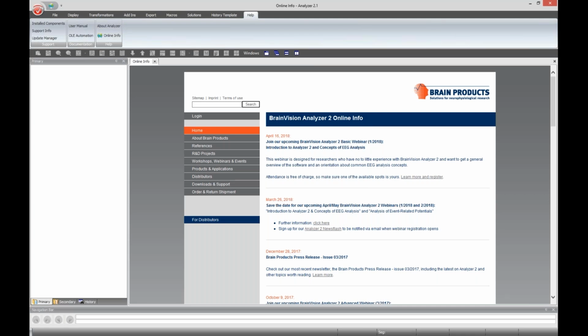Now that we had a quick overview, let's load some EEG data to get familiar with the concepts in Analyzer. First of all, we don't have the option to load or import data when you look here under Workspace or File. We can load a workspace, but let's answer first, what is a workspace? The workspace is a configuration file, and in it we are storing the paths pointing to the dedicated folders of the raw data files, processing steps, and exports.